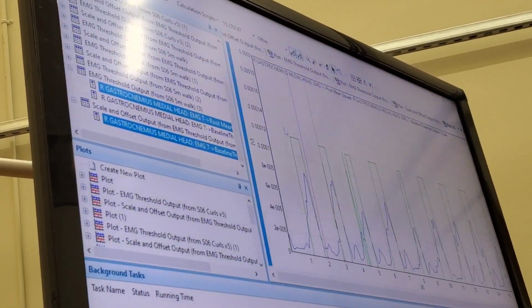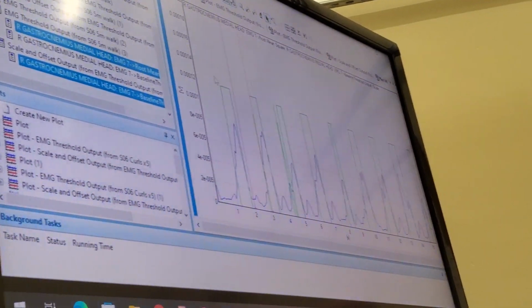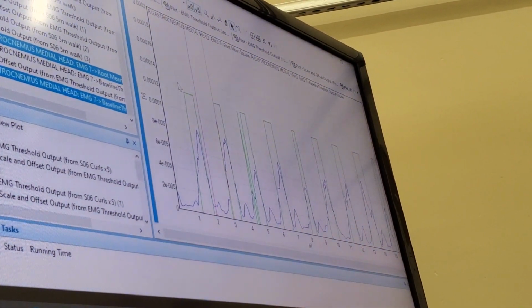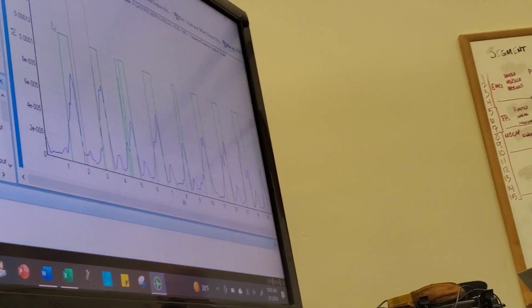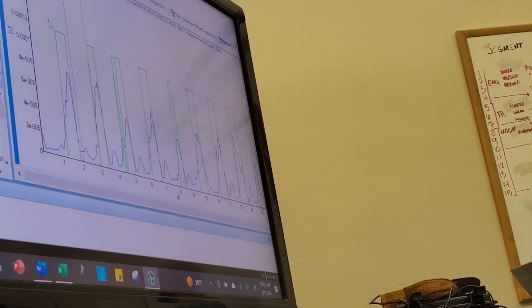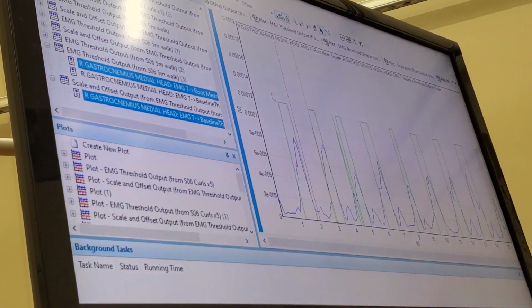So for the files you want turned in by this number, you want Excel files, or do you want the EMG files? So you will export them to Excel. On this portion, make sure that you are exporting not only the threshold calculations with the boxes, but also the RMS tracing as well, so we have both of those.